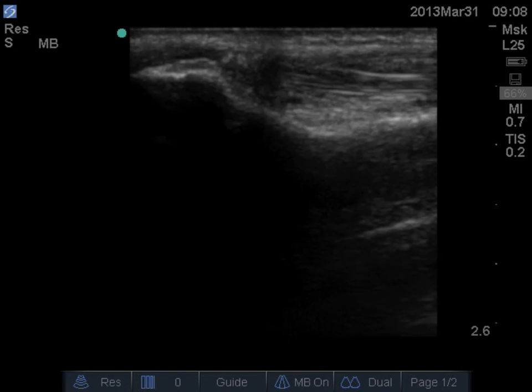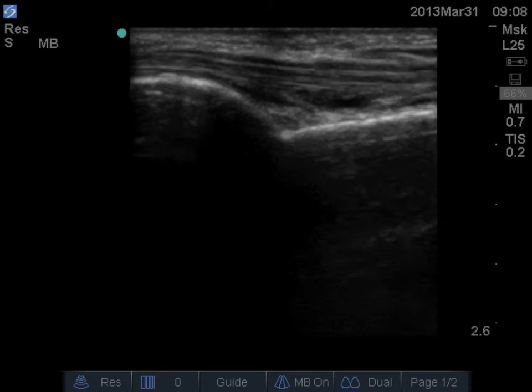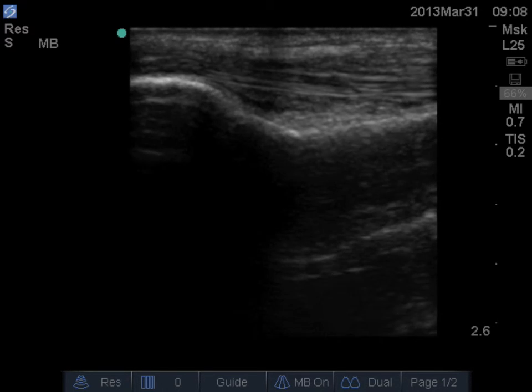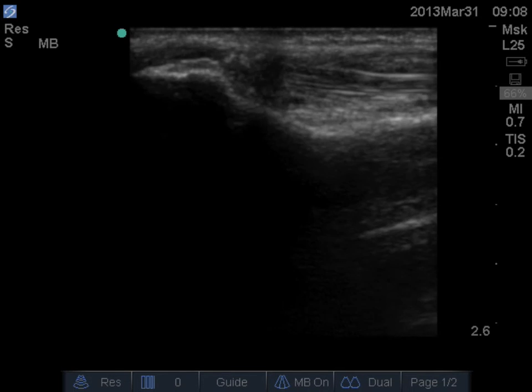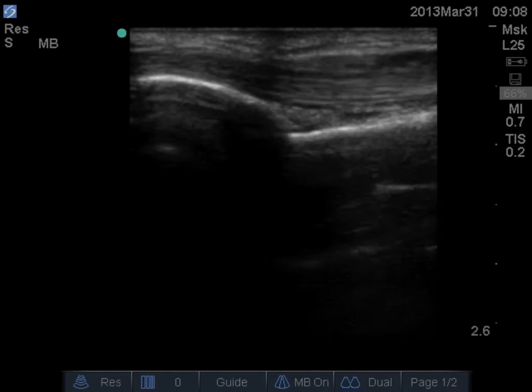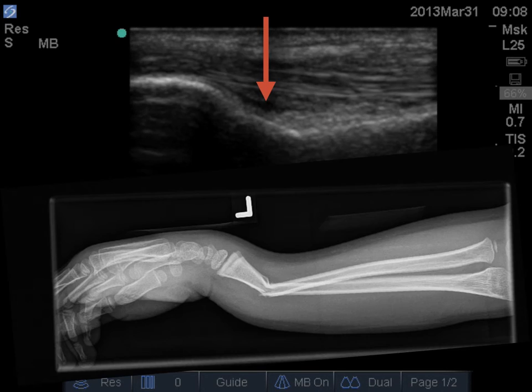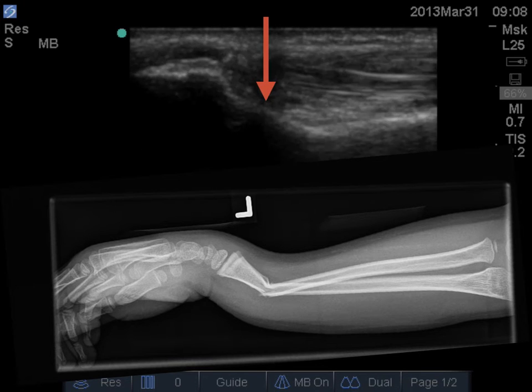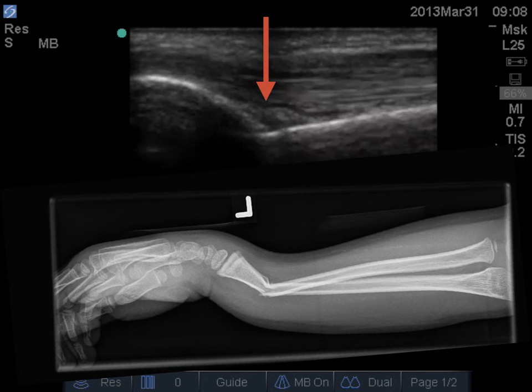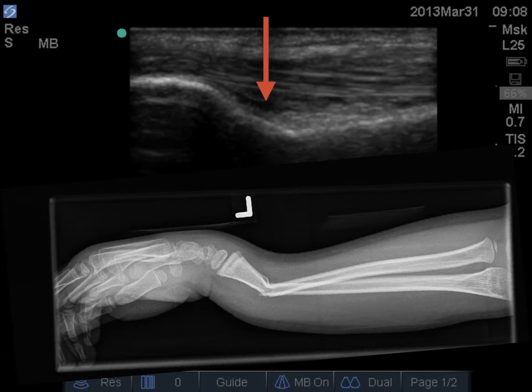How about this distal radius? Is there a fracture? Yes, there is. While there is no big step, the cortex of the bone is not smooth. There is an acute angle located in the middle of the screen. And this is what the bone might look like on radiograph. A small hematoma is again noted between the dorsal bony cortex and the overlying tendons, which appear linear and horizontal.